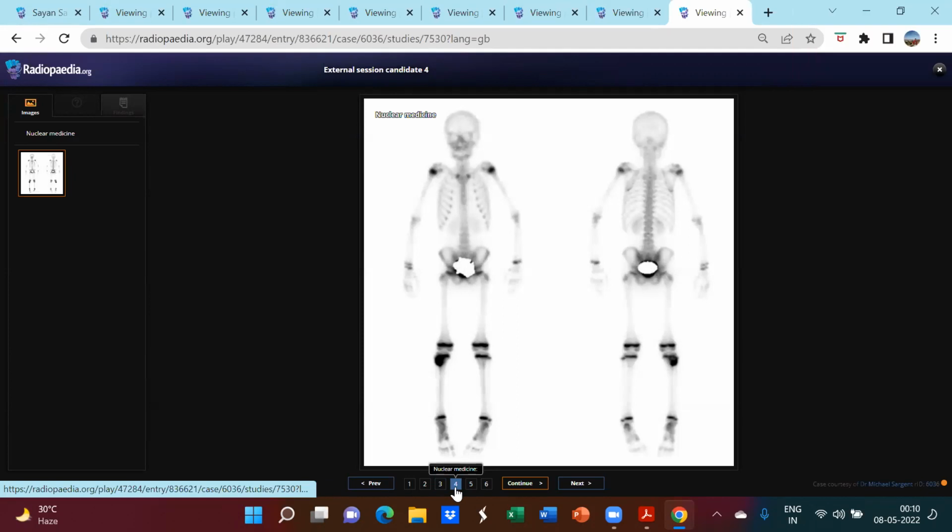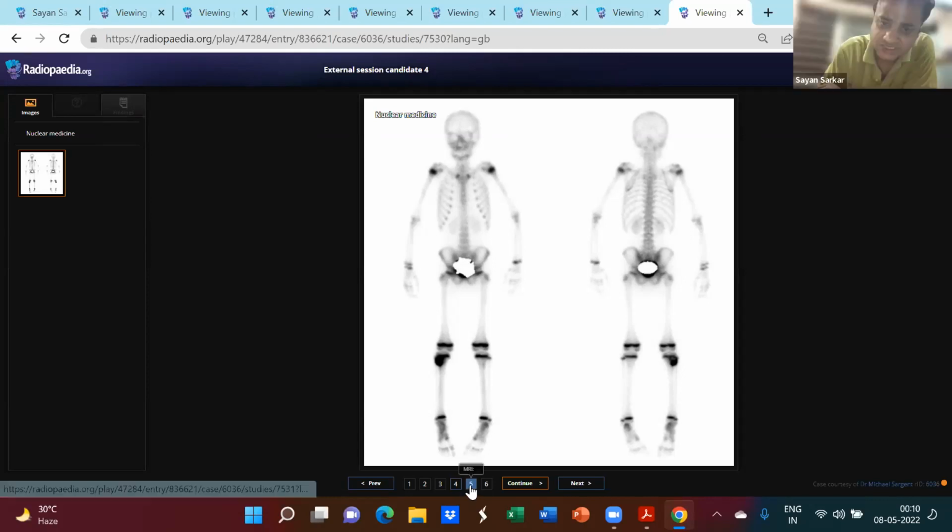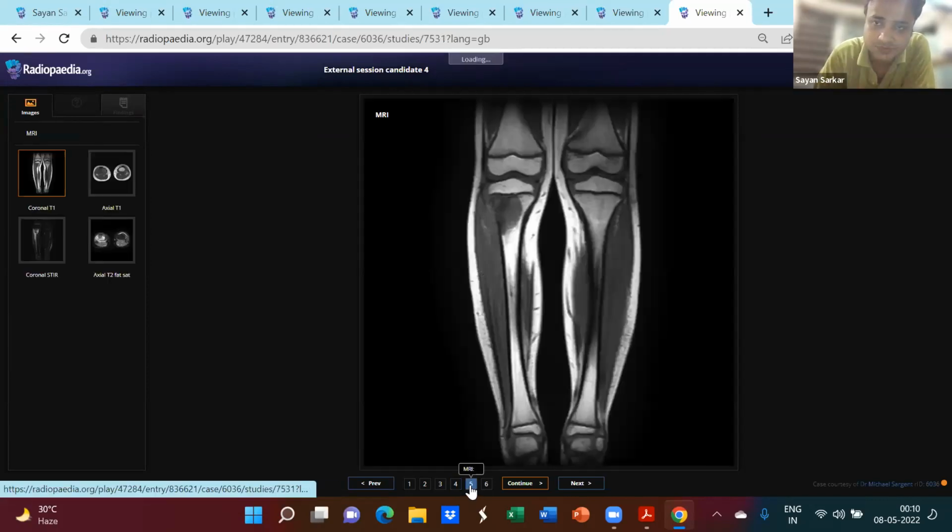A bone scan of the same patient shows focal uptake in the part of the lesion that we have discussed already. I cannot see any further metastatic lesions. Symmetric uptake in the shoulder joints, sternoclavicular joints, and the rest of the joints. I cannot appreciate any focal metastatic uptake in the rest. Fine. So this is just for METs. Now we have the MRI also. And these are also probably just still images. So there is nothing extra.